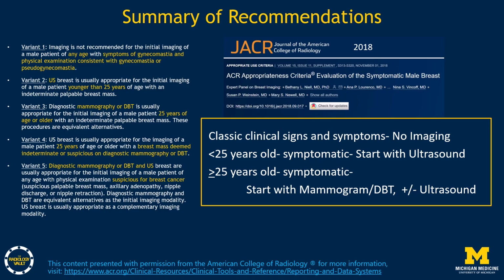In 2018, the American College of Radiology issued the appropriateness criteria for evaluation of the symptomatic male breast in the Journal of the American College of Radiology. The guidelines are to the left, but the summary is that if a male has classic clinical signs and symptoms of gynecomastia, no imaging is necessary. However, if the man is under 25 years of age and the symptoms are not clearly specific for gynecomastia, it is reasonable to start with a breast ultrasound. If the male is 25 years or older and has symptoms that need workup, it's reasonable to start with a mammogram and ultrasound to follow.